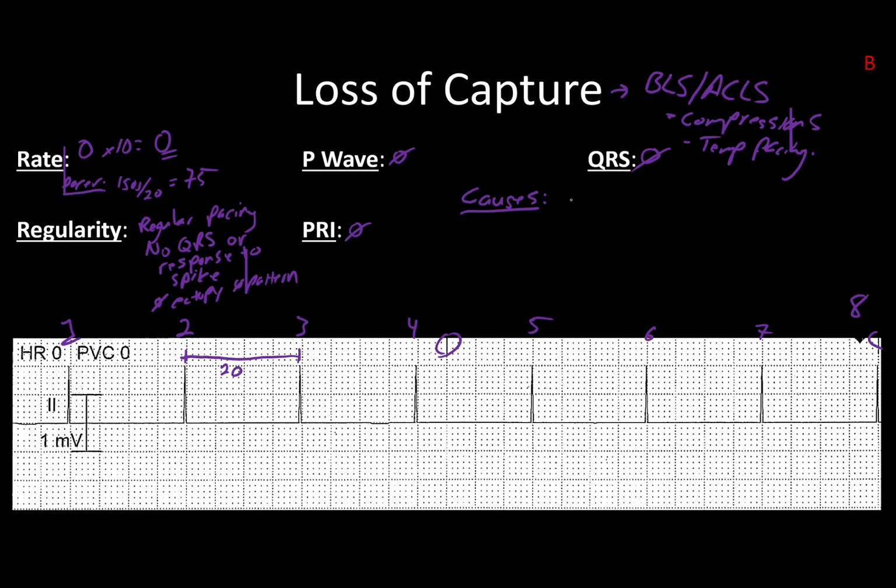It could be severe oversensing. It could be lead fracture, lead displacement.